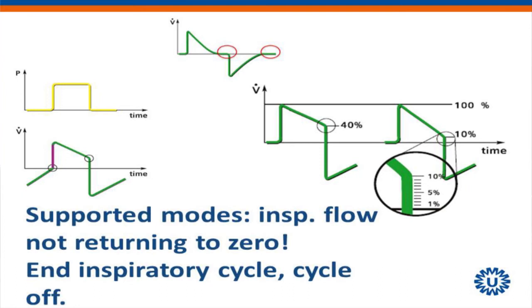What cycle off time do we choose? I don't say it's always correct, but with our neonates we choose a cycle off time of 10%, for really sick lungs. But when we choose in normal neonates a cycle off time of 30-40%, which is standard on most machines, we see that the neonates hyperventilate on the machine. We give them a bit longer inspiration time.